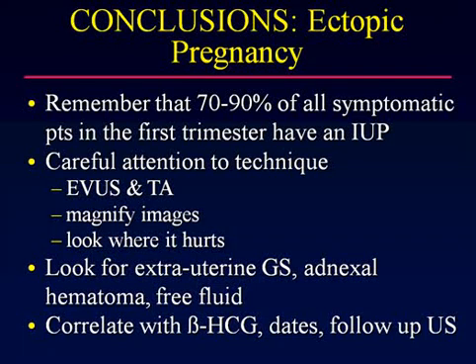You can be 100% positive of your diagnosis if you see that echogenic tubal ring containing the embryo, cardiac activity, or a yolk sac, but you can be fairly certain of the diagnosis even if you see just an echogenic tubal ring. The next most specific finding will be the presence of the adnexal hematoma, which will be much more amorphous and variable in appearance.